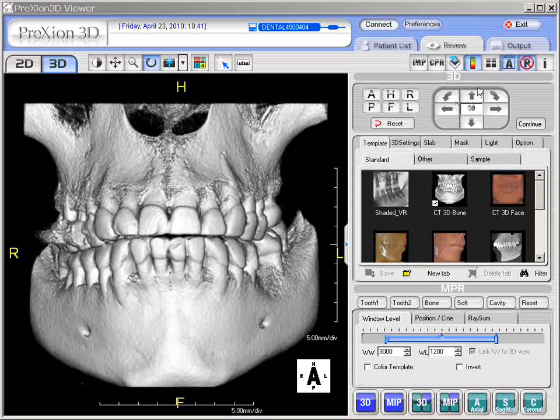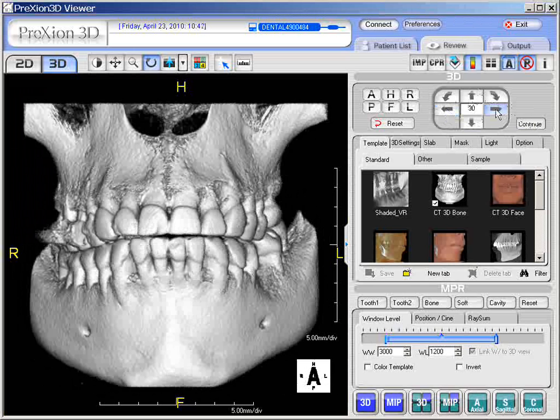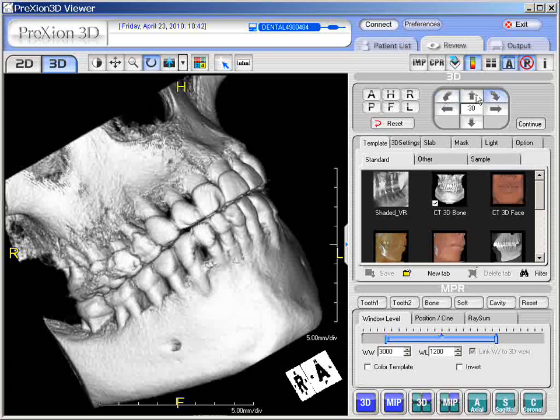This matrix section here gives you the ability to move the image with a click of the arrows and with the direction that you wish to achieve, whether it's straight arrows, left and right, up and down, or curved, either direction that you wish to go.